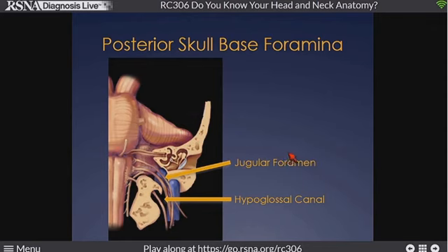When we look at coronal anatomy, we get a chance to make it a little bit easier for ourselves in terms of what we're going to see routinely. The bird's beak has been described as like the birds of the skull that you need to look for, the birds in the body, and this is one of the more classic ones. The bird's beak here at the level of the jugular foramen gives us a jugular foramen above and a hypoglossal canal below. So finding the mass effect on the bird's beak can be very useful in depicting pathology and putting it in the correct space for our surgical colleagues. Jugular foramen above, hypoglossal canal below.